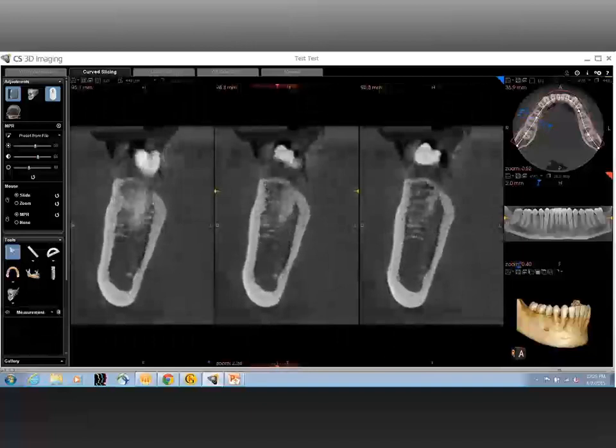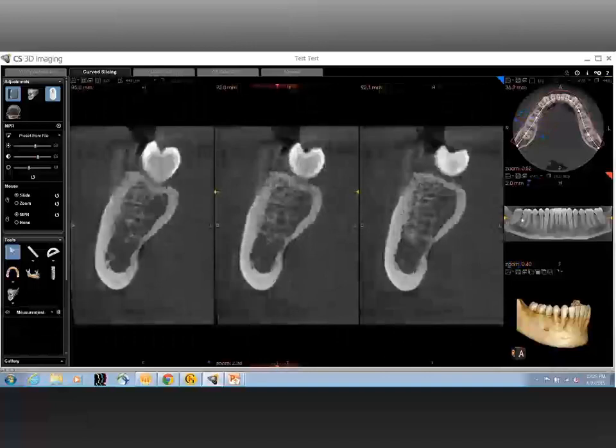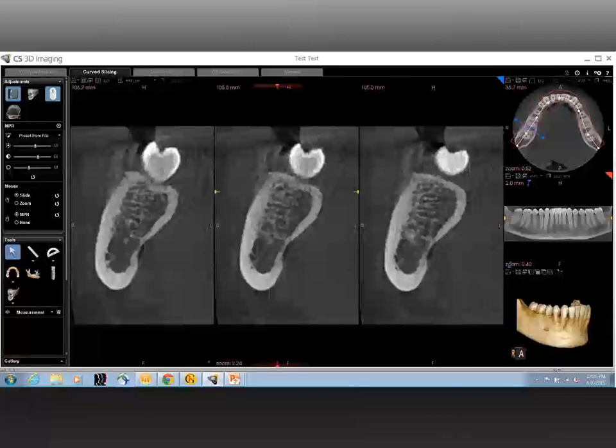If you look over there to see how the crestal bone is not exactly in a linear plane. It is curved, and that could easily change as you move from one slice to another or from one location to another. And you also need to know that area to be able to identify how much length and breadth of the implant is to be placed in that particular region.